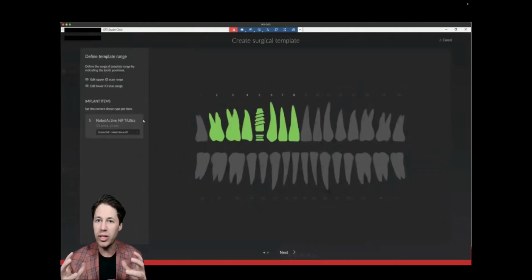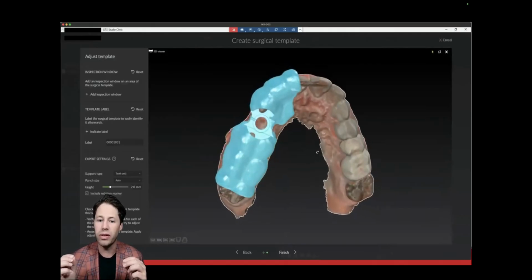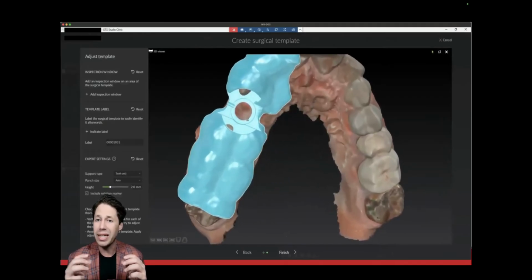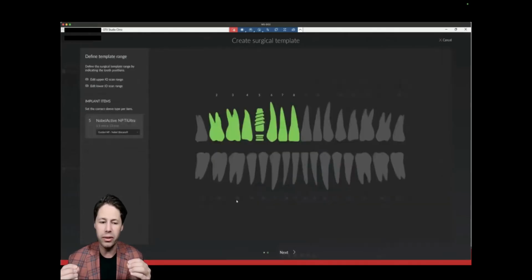So once we know what we're going to do in terms of the implant size and location, now I'm going to design a surgical guide to make the implant surgery take less than 5 minutes. And once you're numb, we're able to start moving very quickly. There are different ways that I can make these guides, which is what I'm trying to show in this figure right here.